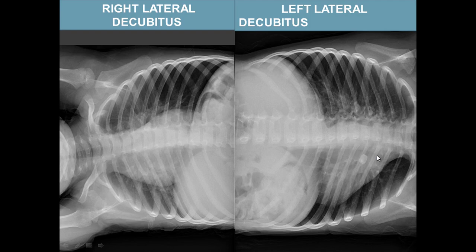But in children, expiratory views are basically not possible because children are non-cooperative. So we can ask for a lateral decubitus view instead. Now here the foreign body is on the left side, so we ask the patient to lie in a left lateral decubitus position. So what happened? In a left lateral decubitus view, air is normally expelled, but here air is trapped.